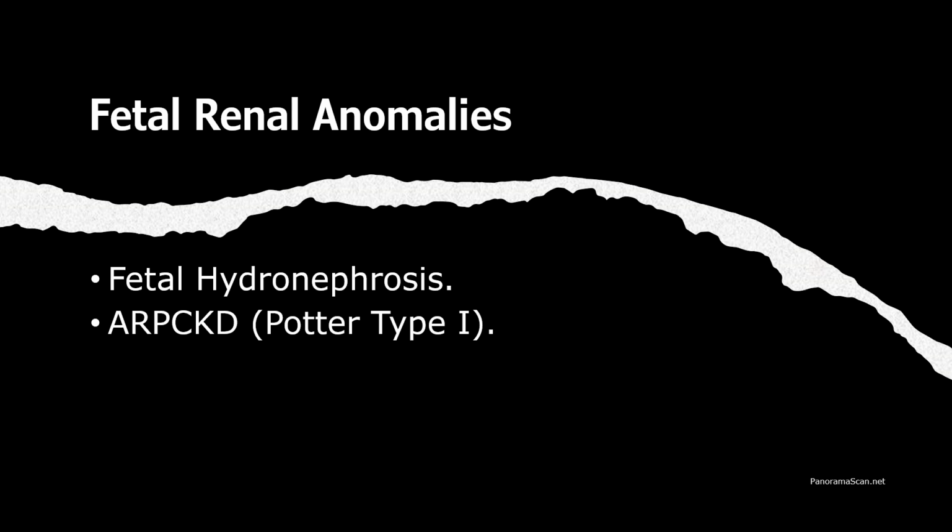Early ultrasound evaluation is essential for detecting these conditions, assessing severity, and guiding prenatal counseling and postnatal management. Let's take a closer look at each of these conditions, starting with fetal hydronephrosis.